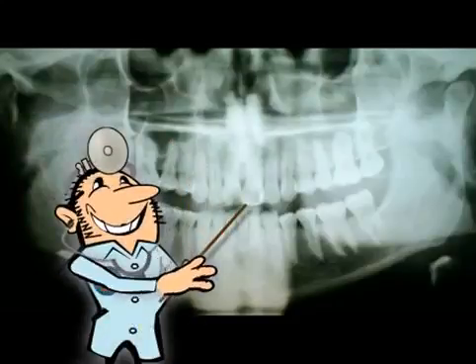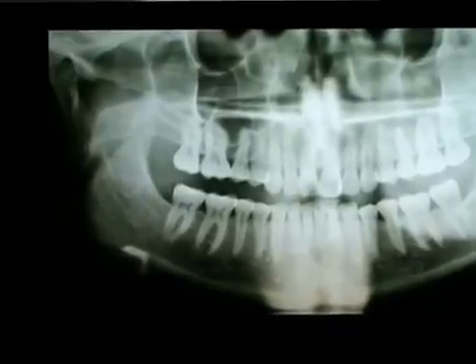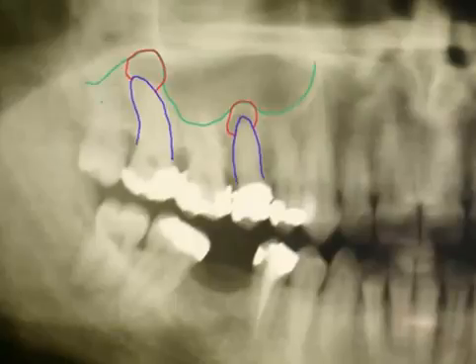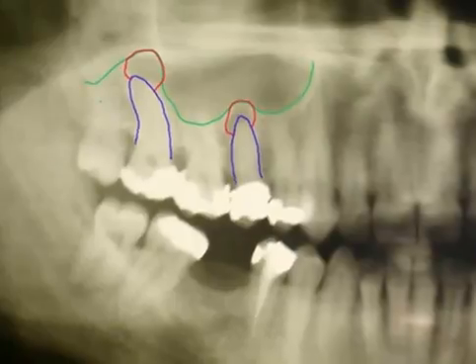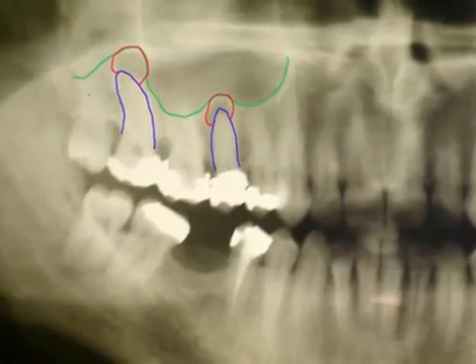An experienced doctor can tell a lot more from a panorama view. The structures described here enable a general overview. The contrast, clarity, and demarcation of the structures in question are also analyzed, not just the structures themselves. Now you can see a panorama picture of the source of a toothache. The demarcation of the maxillary cavity is green. The tooth is marked in blue, and a spot on the root tip is marked in red.